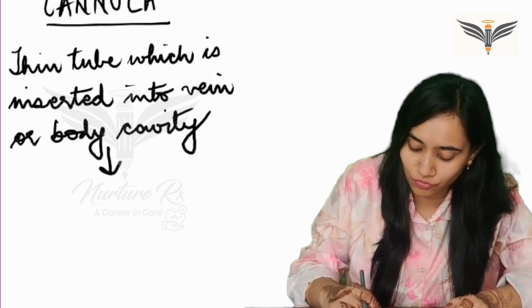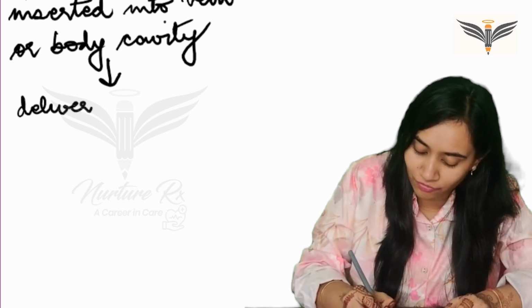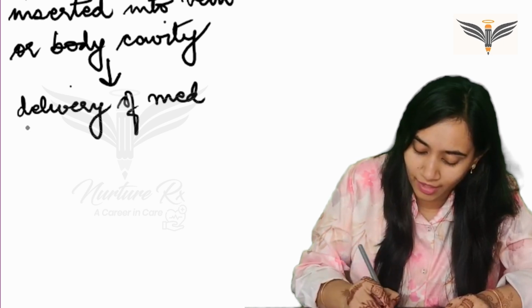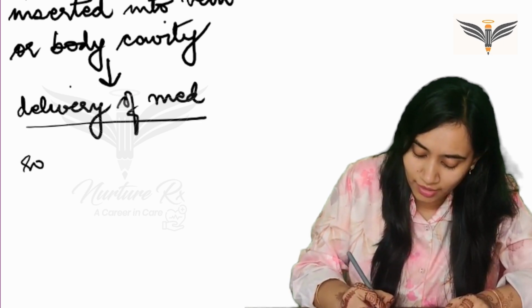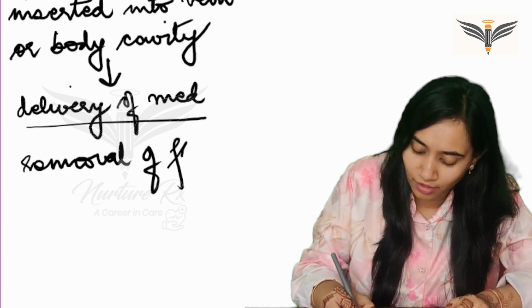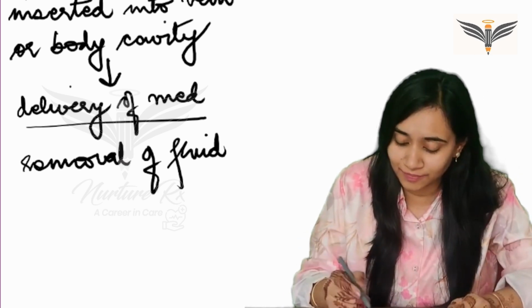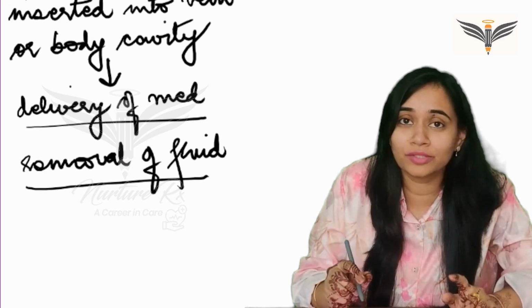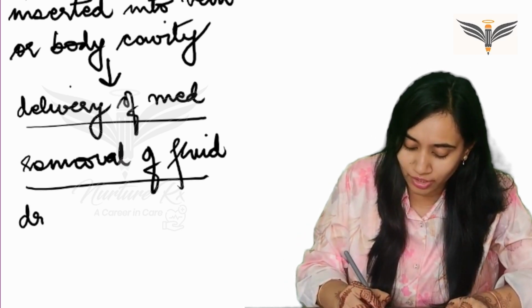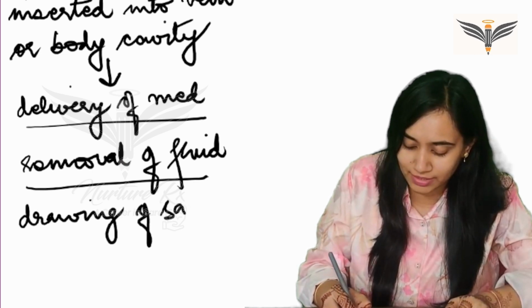It is used for delivery of medicines or removal of fluids from the body cavity that it is inserted in. And third and most important, the use that we usually see is drawing of samples.